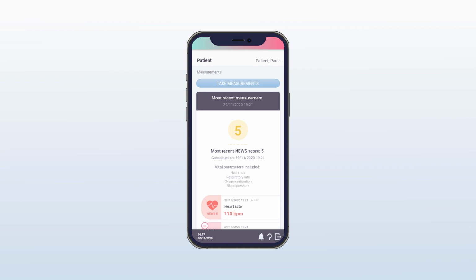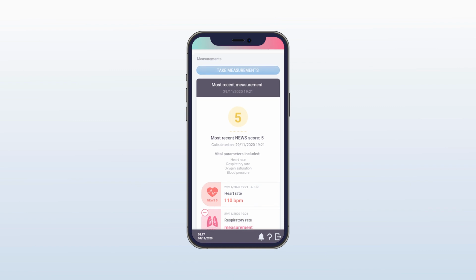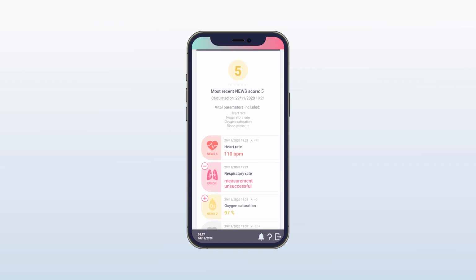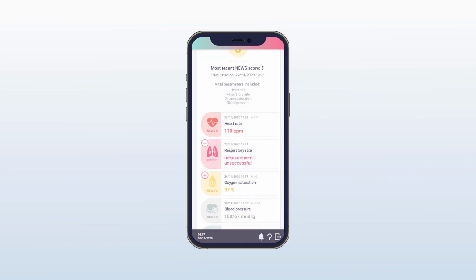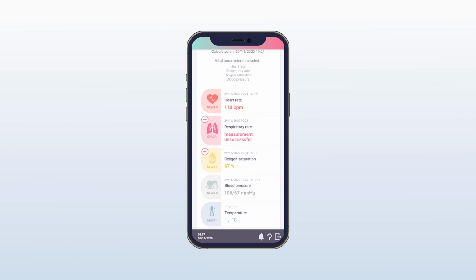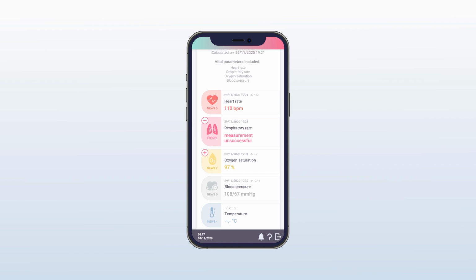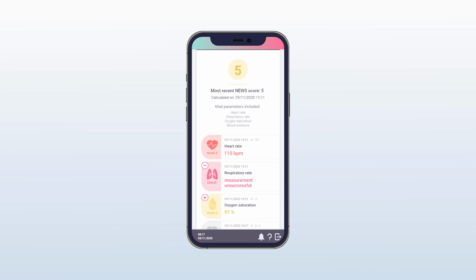The client page showcases a vertical overview of all recently conducted measurements and a shared total warning score for all eligible recent vital signs values. All vital signs also display their individual measurement time, measurement value, and a color-changing icon. A blue color accompanied with an empty value means no recent results for a particular vital sign are available, whereas a magenta color identifies an unsuccessful measurement, often caused by a poor quality source video.